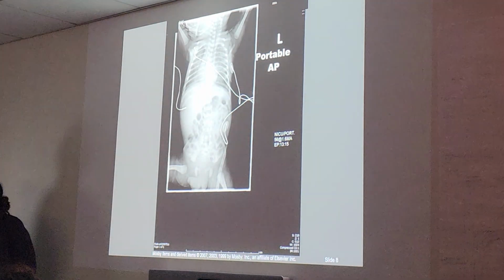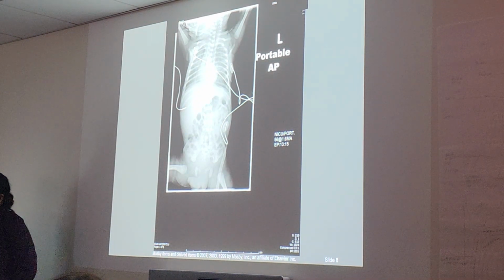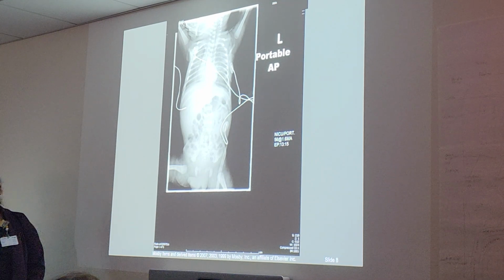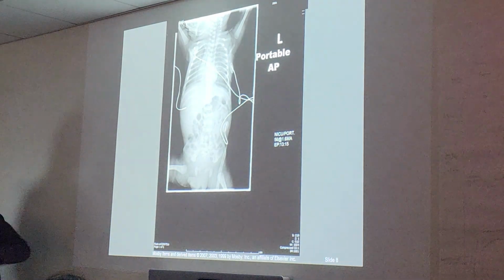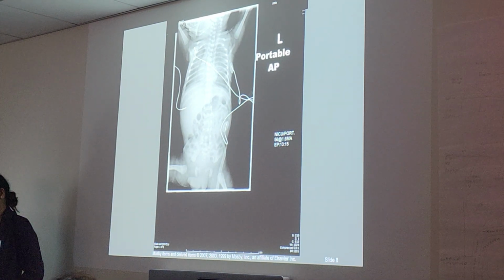What about this one? It's the baby. What's the S value for a pediatric abdomen? 200 to 700. Okay, good job. She came in late, but she knew it. So this one is 210, which means it's in the range.